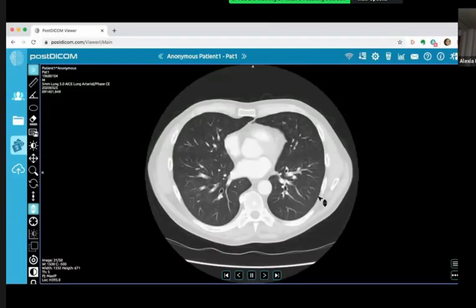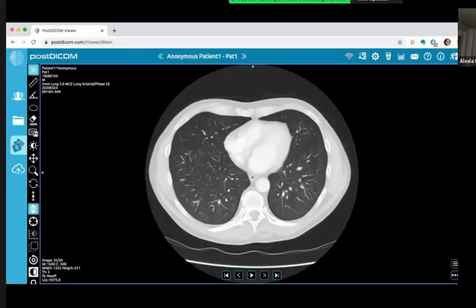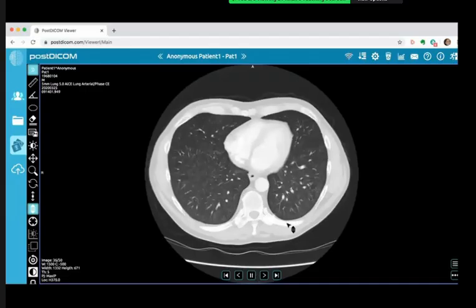So what other additional features would you look for? I don't see pleural effusion. I'll look at soft tissue windows, but I don't think there's any obvious lymphadenopathy. I don't see any volume loss or lung collapse. This is a very florid picture bilaterally, so it's probably something affecting the whole lung. Somehow an inflammatory process, possibly a pneumonitis again.